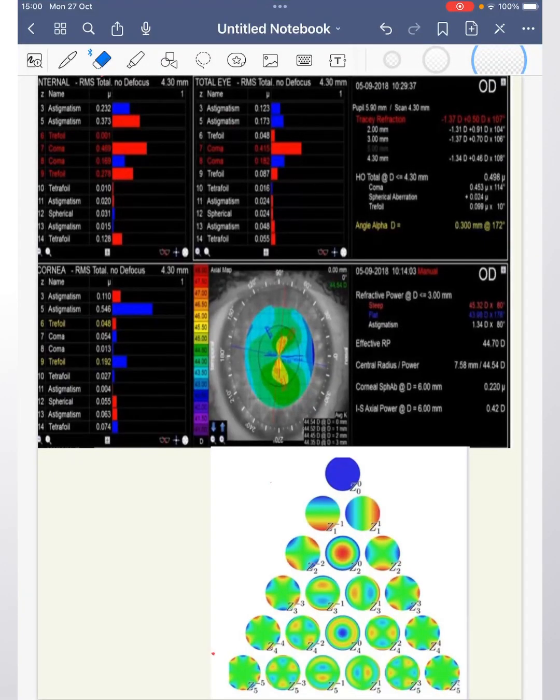Friends, in this video, I'm going to give a quick explanation of the Chang Analysis page that we generate from the iTrace. In fact, if you understand this page, you will understand the other reports that the iTrace generates because they are very closely interrelated.